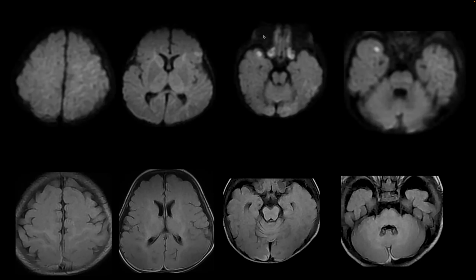You mean the parent? I didn't get the question. Sorry. There were some hyperintensities noticed in the basifrontal region in the first scan. They are possible. Yeah, we are not debating about that part. Only the subdurals associated around the posterior convexities.